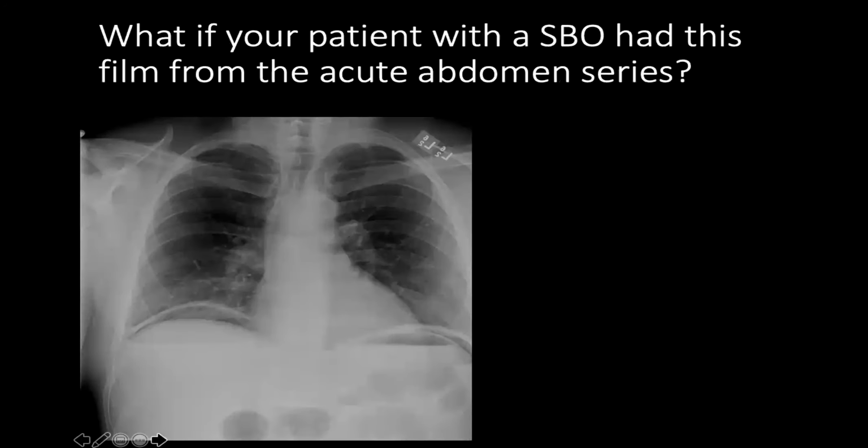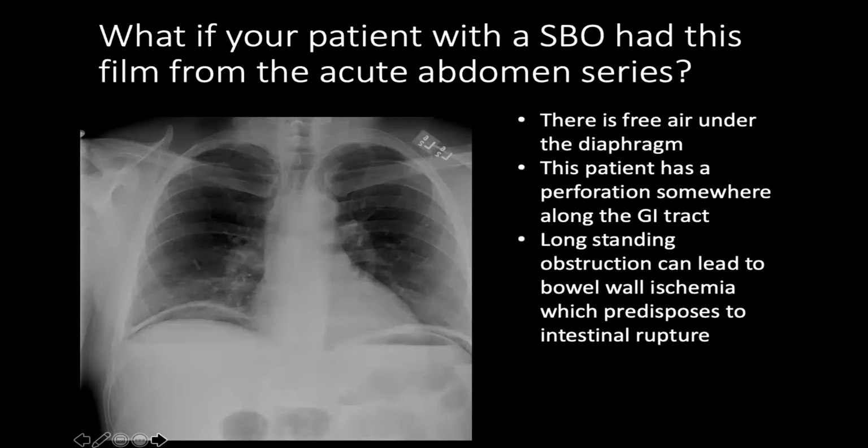What if they also had this as a film from the acute abdominal series? What do we see here? There's free air underneath the diaphragm. And this is most likely a perforation somewhere along that GI tract from that obstruction. And a long-standing obstruction can lead to ischemia, which then can cause this rupture. And this is a medical emergency.